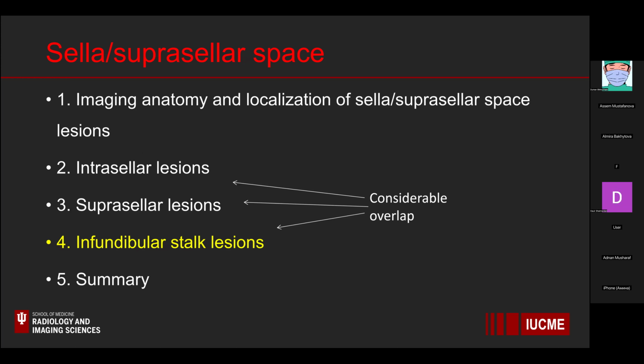Yeah, from a meningioma. Schwannomas will cause remodeling, particularly of neuroforamina or skull base foramina. But meningiomas will have the infamous dural tails. So when you see dural tails and you see the broad dural base of the lesion, that is your clue that you're dealing with a meningioma. Schwannomas will never show you dural tails. They'll never have a broad base along the dura. So that's the distinction, even before you do perfusion imaging.